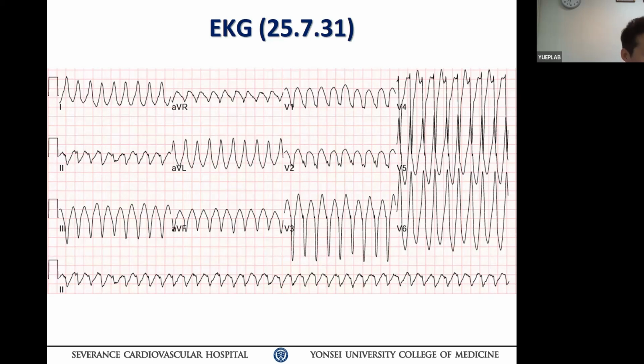280, and left axis deviation, broad complex tachycardia, which pattern is ventricular tachycardia pattern and superior axis. And also there are unrelated P waves in lead II.